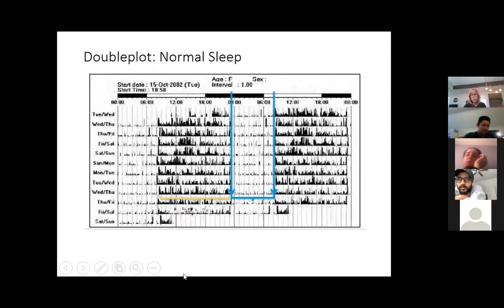And this was an older way of displaying things. And it was nice because you could see the free running really easily. But this is this, this is this. See how they're repeats? Actually, the newer software doesn't even show it. But this shows up on board exams. So I didn't want you to get messed up on your exam if they show you a double plot.